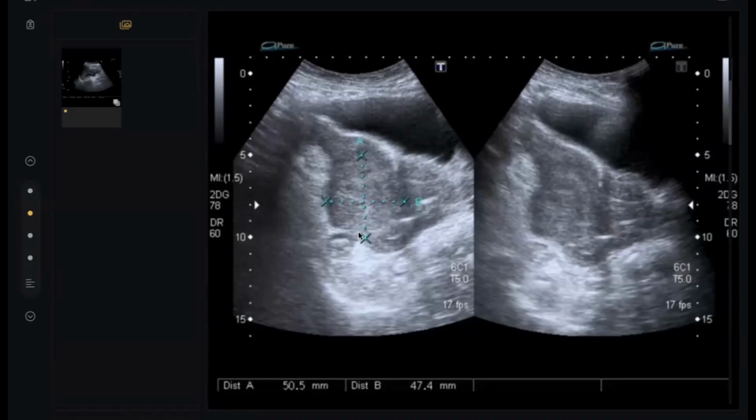There is also a focal echogenic mass lesion centered adjacent to the bladder causing compression. It is relatively homogeneous, well defined with few linear echogenic foci seen within. It is anterior to the rectum and posterior to the bladder. It shows posterior acoustic enhancement. Are you sure? No enhancement. Oh, sorry. What do you want to do next?